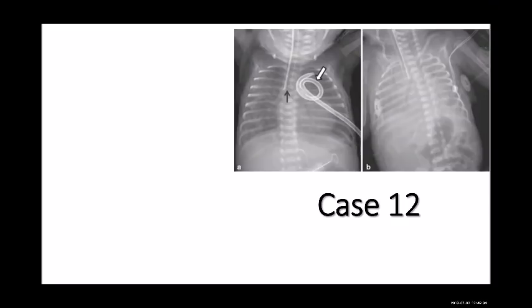Anybody else than Ilhama? Everybody is listening. Just contribute so the discussion will be worthwhile. Yeah, it looks like there is atelectasis, like a small area. Oh, don't go to that point. I told you, just describe what you've seen. Yeah, so I'm going to describe it for you. Is that okay? Yeah, for sure.